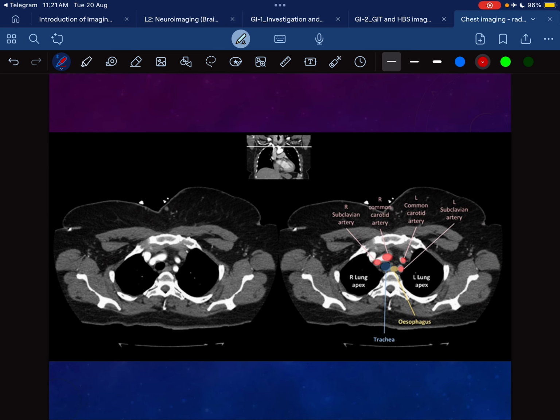Okay. So CT chest is basically multiple X-rays. We use it with a special computer that can create these images. There are 3 planes: axial, where you slice the patient top to bottom; coronal, anterior to posterior; and sagittal, medial to lateral. This is axial, this is coronal. So we are at the top of the chest or thoracic.